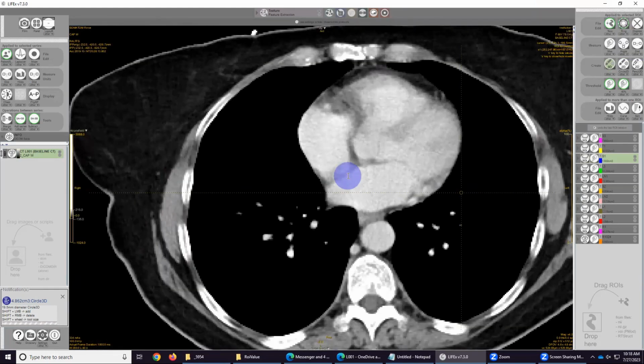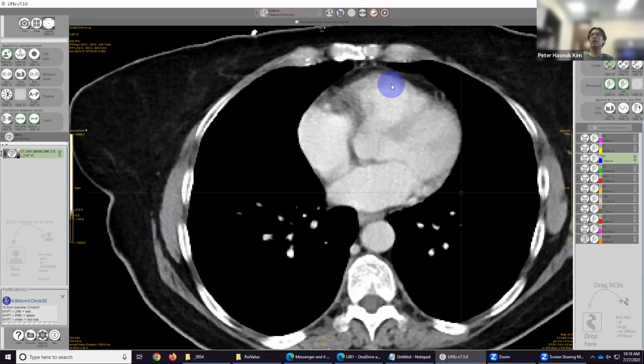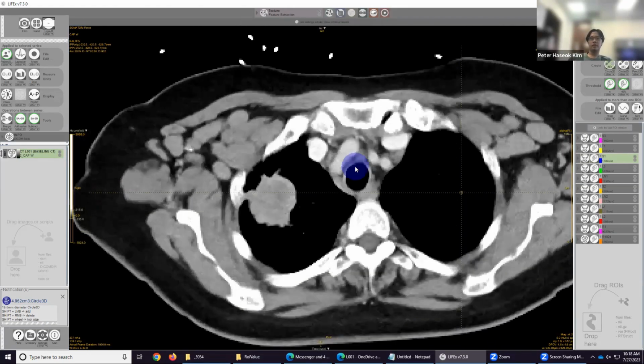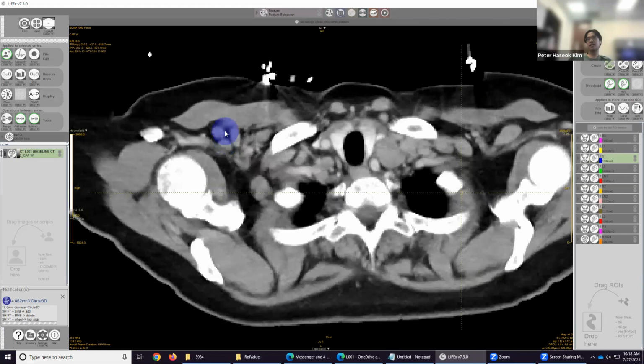If possible, even when segmenting mass or lymph node, we would still want to not segment vascular vessels, right? Great vessels, right. For lymph nodes, it should be very easy to avoid them, because they're so small, and there's not really any vascularities that you can see on the CT scan anyway. A lymph node looks pretty homogeneous, like a kidney bean, right?